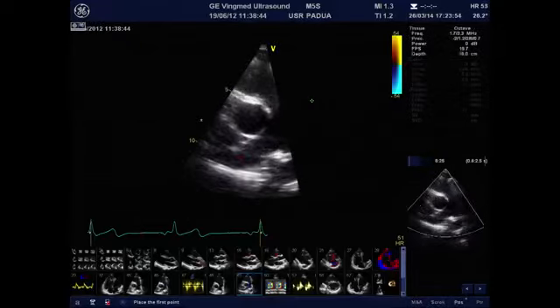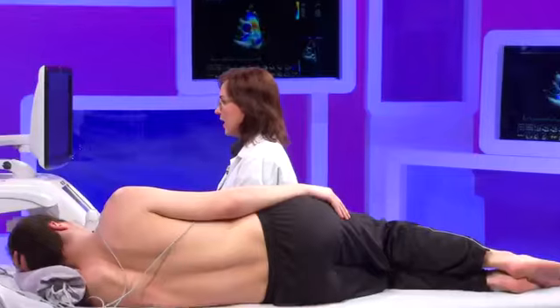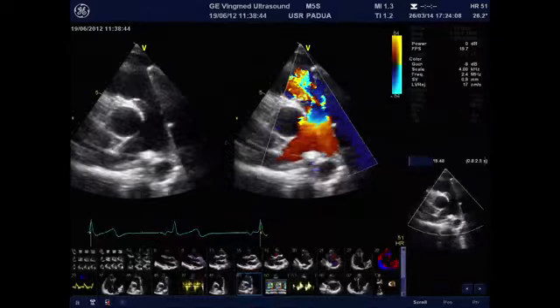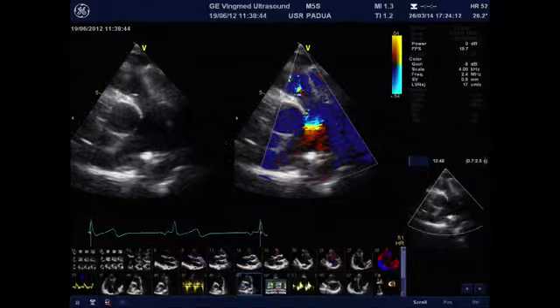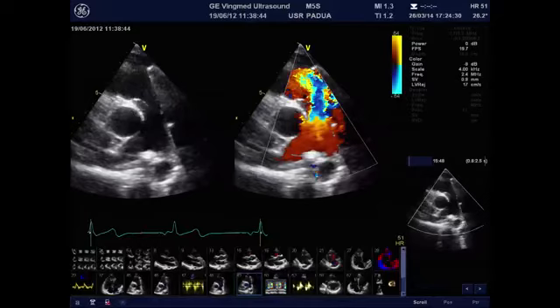And then you can appreciate by performing the ratio between the right ventricular outflow tract and the thickness of the vena contracta. If the ratio exceeds 0.65, it is indicative of severe pulmonary regurgitation. There is no defined cutoff for the absolute thickness of the vena contracta in pulmonary regurgitation, but just this parameter of the ratio with the right ventricular outflow tract.